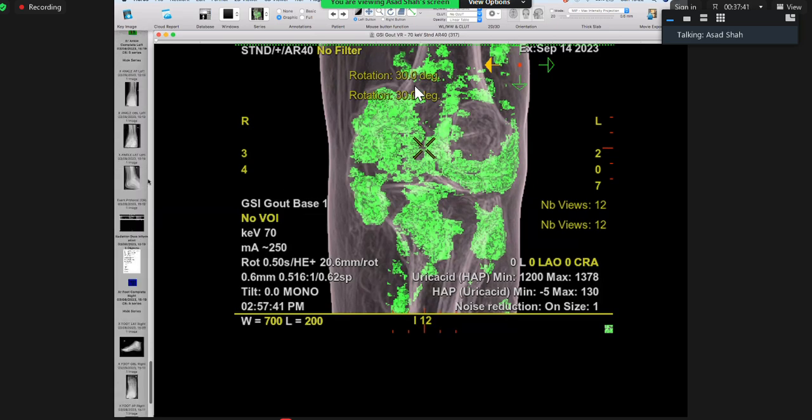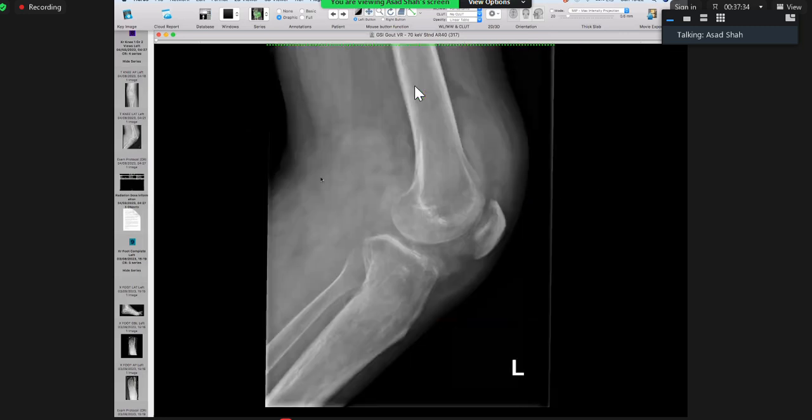So when I put the X-ray back for you, the knee X-ray, fair enough, you can say some kind of synovial process, but synovial osteochondromatosis on the basis of exposure on CT, it might be because it's very calcified and lumpy. But here, again, it's hyperdense. You can see the whole extent of the abnormality. But you can say some synovial pathology. I think that's probably a better term, because synovial osteochondromatosis is something different, all right?